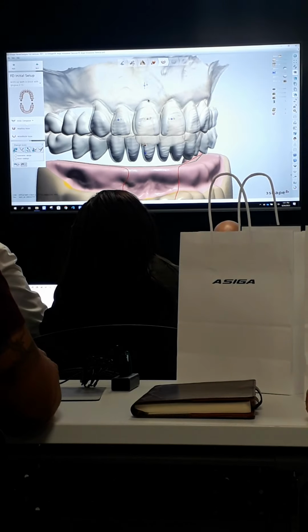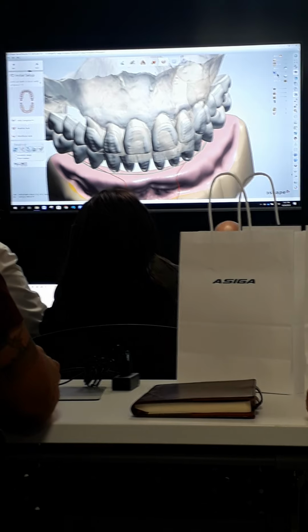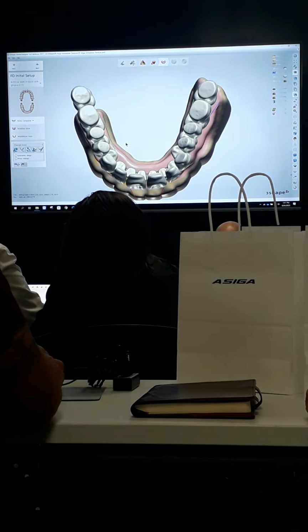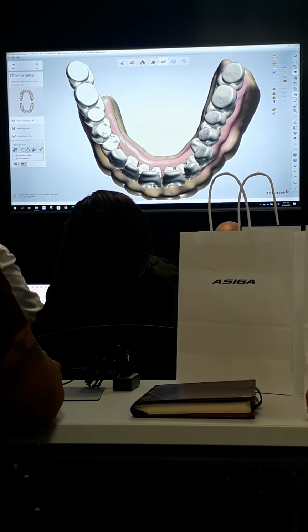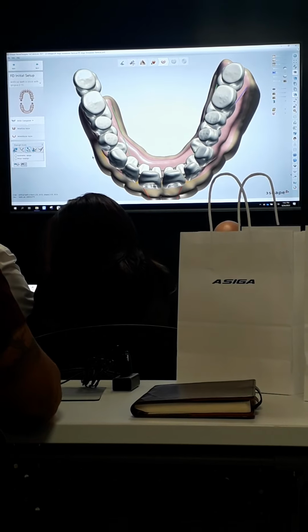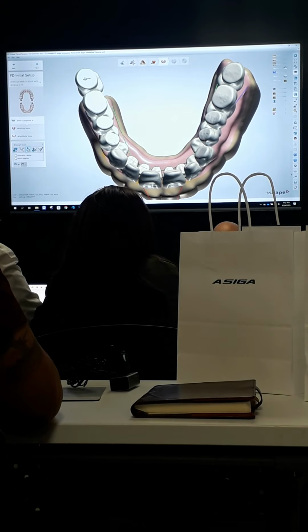Go back and show us what you can do in the posterior. The posterior? Yeah. So I turn off the upper scans, and I look at it from a view above the lower ridge. I have to make sure I'm in this tool right here, this middle one. If I left click and grab from the first bicuspid, I can drag the whole segment around. I do exactly the same thing on both sides at the same time, since you probably have a symmetric design to work on. So when you do that, you'll position it, and then if you grab it from the last molar, you can tilt.